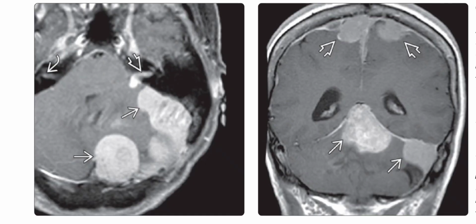Left is the axial T1 weighted contrast-enhanced MRI of a 70-year-old woman with neurofibromatosis 2, and it shows extensive meningiomatosis with dural-based masses in the posterior fossa. There's a small enhancing mass in the left internal auditory canal or cerebellopontine angle, and a tiny, almost imperceptible one at the fundus of the right internal auditory canal.